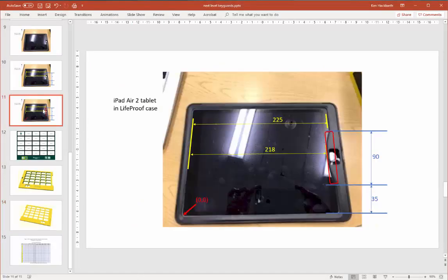And where do they go? Well, there's going to be one right here, where right now this cuts in sharply, and we just need to know the distance.